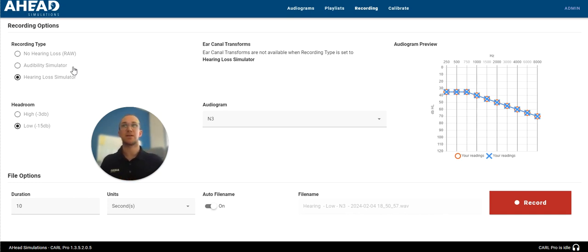So there's a million different scenarios out there, and we would definitely recommend you to try a bunch of different options inside of this recording tool. And remember, it is meant to be an open tool, so we do provide these options so that you can really customize it and use it how you wish. We're always open to other suggestions as well, so if there's any settings here that you wish this really had, please feel free to reach out to us.